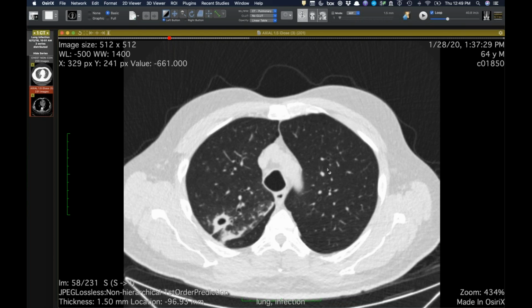So are you saying that, let's take an older, thin female patient that ends up with the typical right middle lobe and lingula, do you think they have an initial infection, or do you think they just are colonized? No, I think often it starts with this, because I've seen this progress to other locations. It's as if the lesion relatively clears up here sometimes or diminishes, and then it involves those more dependent regions.